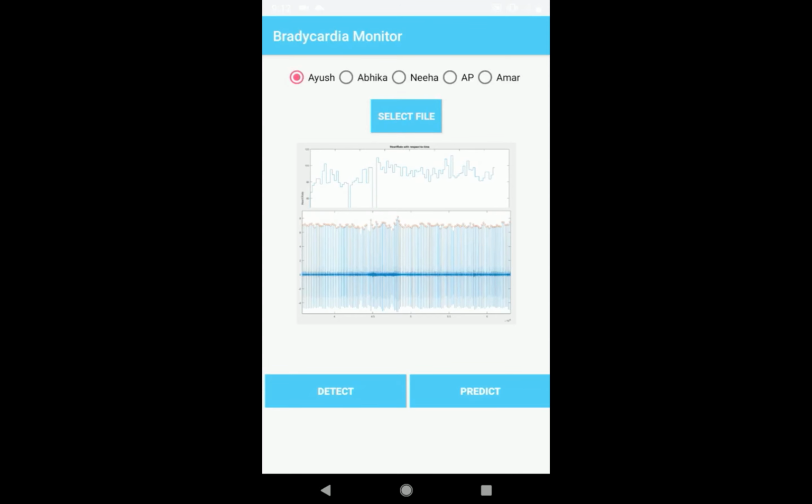In the sliding window of 4 minutes, we calculated the average heart rate of each sliding window, and then compared it with the threshold. So this is bradycardia with window. Without window is manual annotation, basically, which is just comparing every heart rate with the same threshold, 60. We are doing both of these in order to compare the false positives and false negatives.